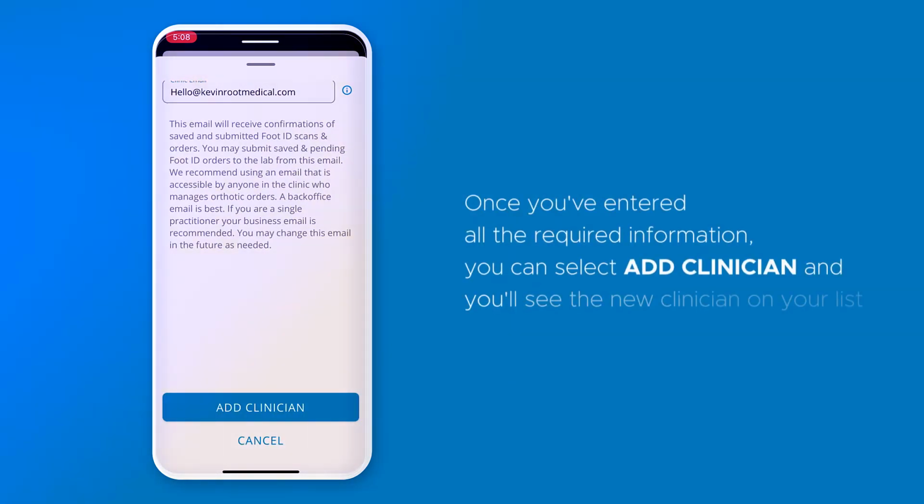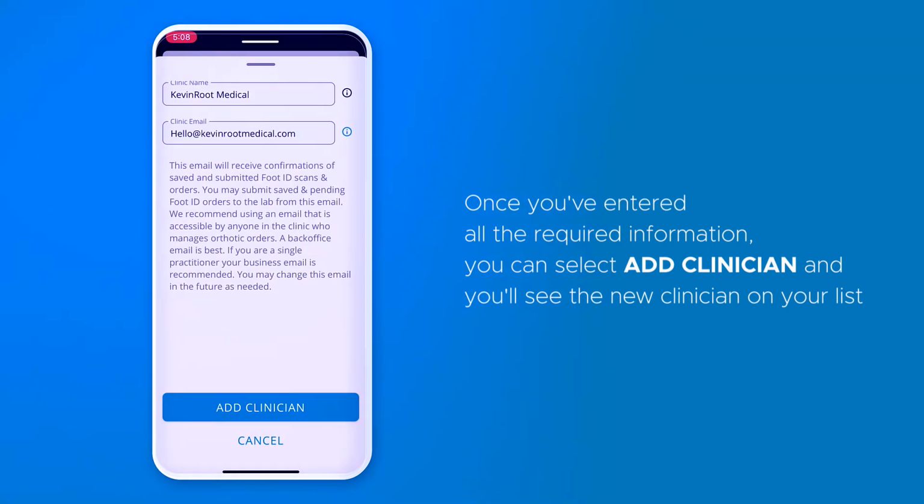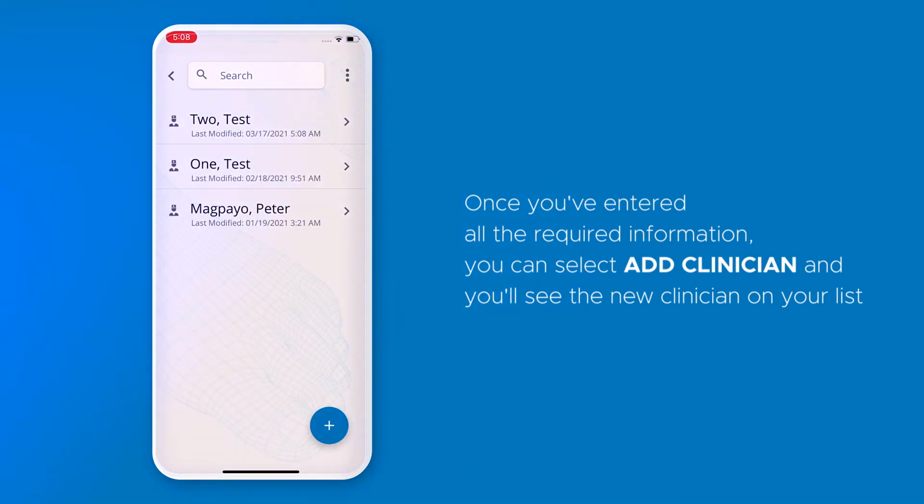Once you've entered all the required information, you can select Add Clinician. And you'll see the new clinician on your clinicians list screen.